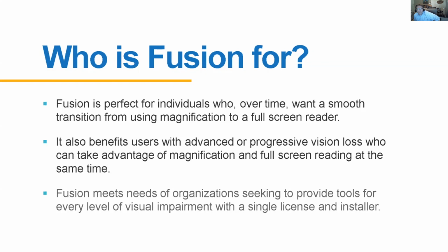So who's Fusion for? It's perfect for individuals who over time want a smooth transition from using magnification to a full screen reader. It also benefits users with advanced or progressive vision loss who can take advantage of magnification and full screen reading at the same time.